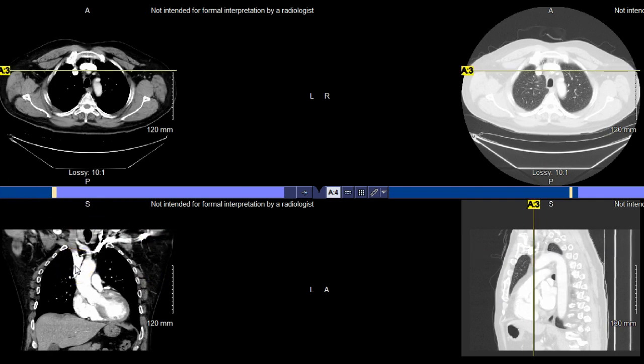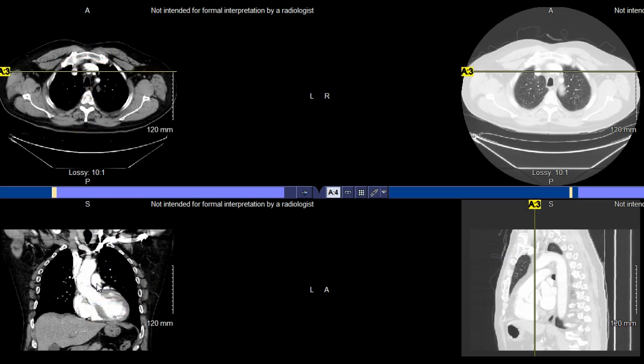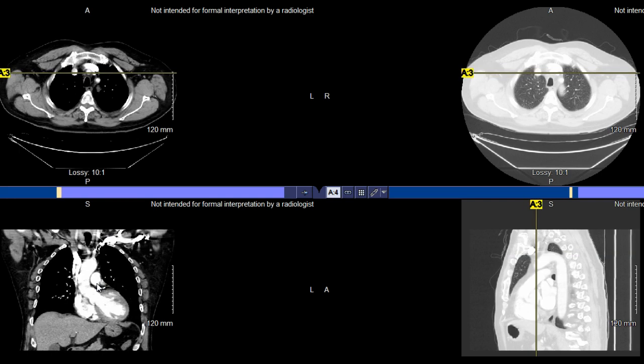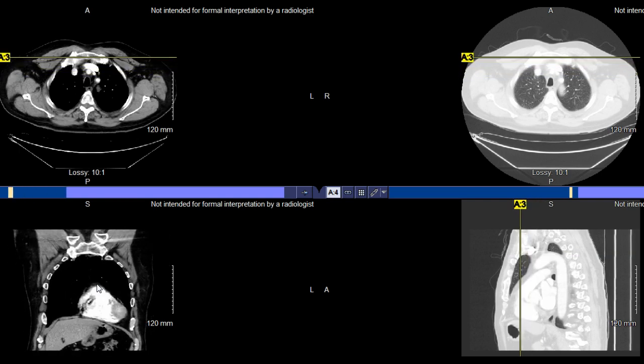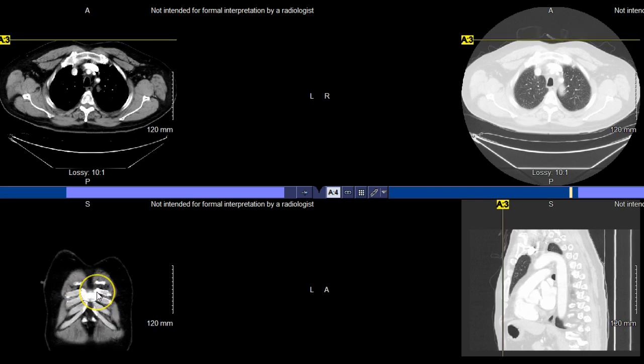I do want to go through from anterior to posterior, just so you can get some of these visualizations. Let me just stay right here when we're looking at some structures, so you can get a sense of where we're looking at. So essentially, we're on the anterior side. Pretty cool image. You can see those ribs connecting to the sternum, that costal cartilage, those connections.